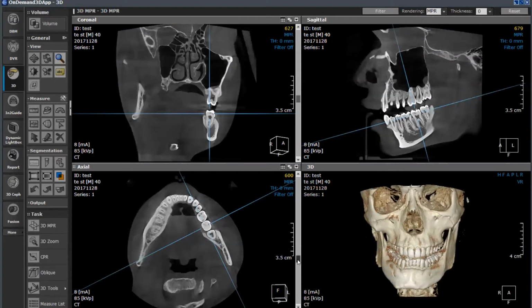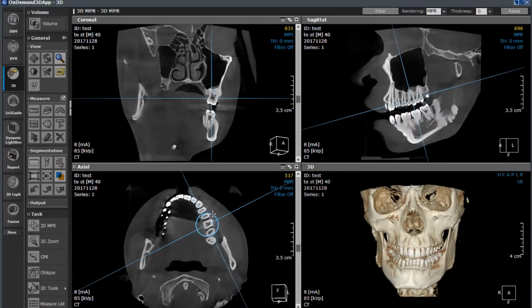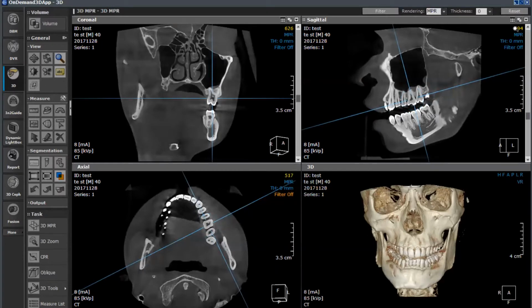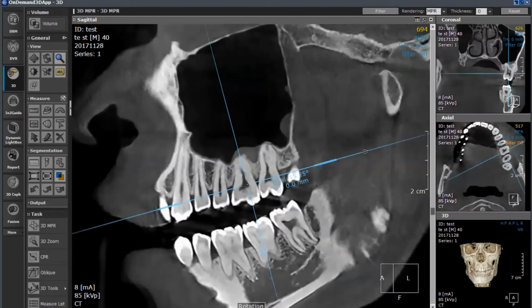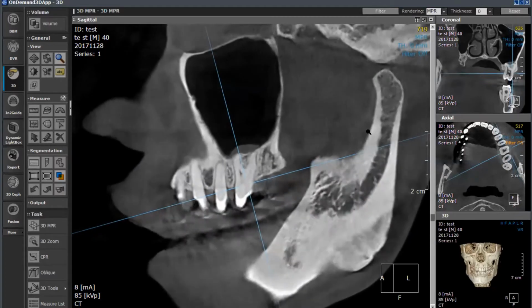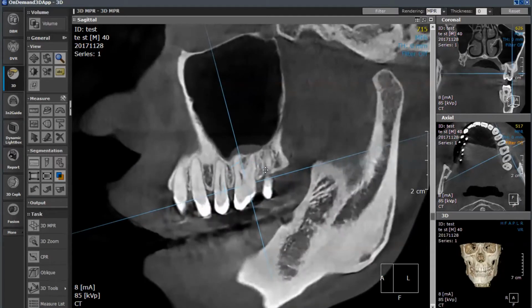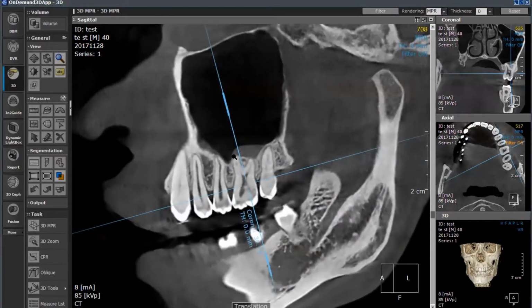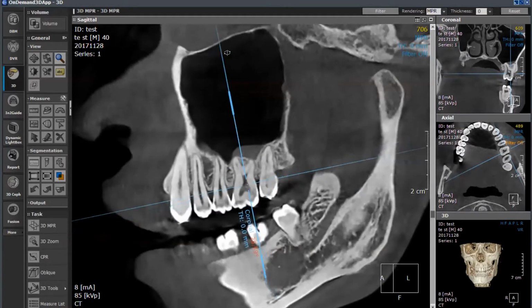And so in this case, we're going to go ahead and look at the maxilla up here and be able to, again, focus on this tooth. But now, because I've moved with the maxilla, I can now get a better picture of the maxilla in my buccolingual view. Again, I'm going to move up, and I can go all the way from buccolingual. So moving from buccal to lingual in the maxilla, we can see that here's our tooth here. You can see a slight bit of sinusitis on top, but now we get a much more distinct view of our teeth from angles that we appreciate.